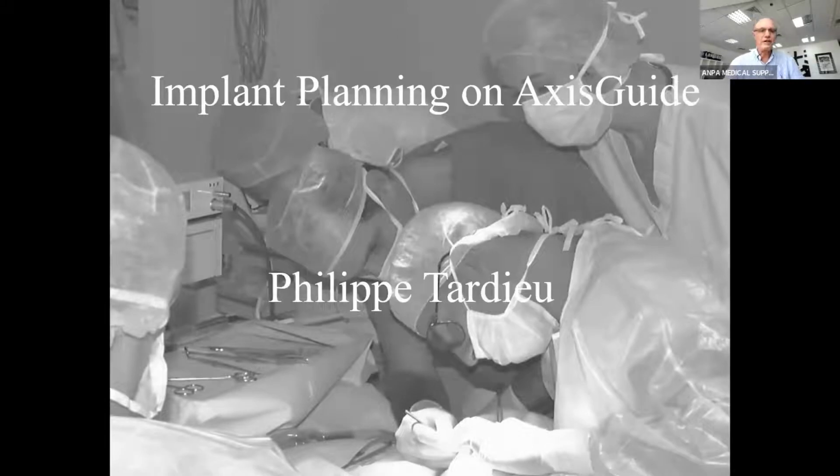Good afternoon, all folks, and I'm very happy to present to you what we can call the implant planning on AxisGuide. This is based on a huge experience that we have, not only by ourselves, but by our customers who are working with AxisGuide. And we know that they come back to us with the same questions all the time. How can I plan my implant in a proper way? I am too deep, or I've not enough bone, and all that. And this is the question we're going to go over.